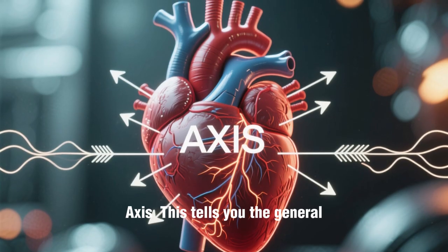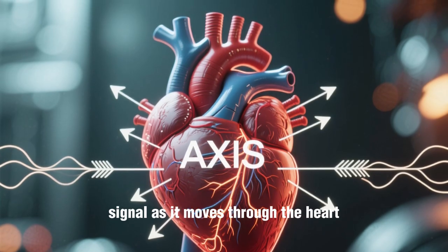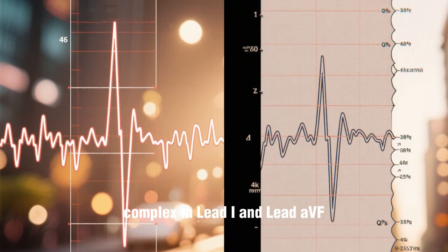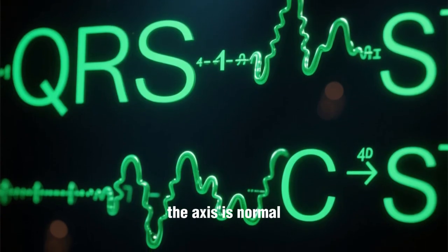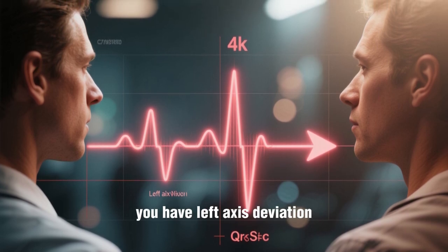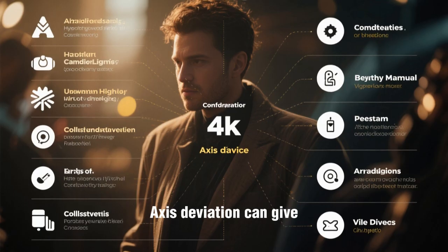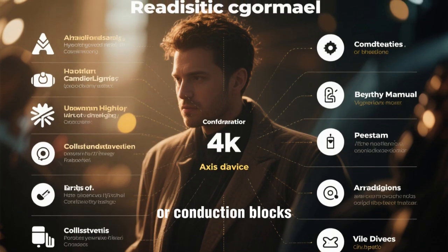Step 3. Axis. This tells you the general direction of the electrical signal as it moves through the heart. Normally, the axis points down and to the left. A quick way to estimate the axis is to look at the QRS complex in lead I and lead aVF. If the QRS is upright or positive in both leads, the axis is normal. If it's positive in lead I but negative in aVF, you have left axis deviation. If it's negative in lead I and positive in aVF, you have right axis deviation. Axis deviation can give you clues about conditions like ventricular hypertrophy or conduction blocks.